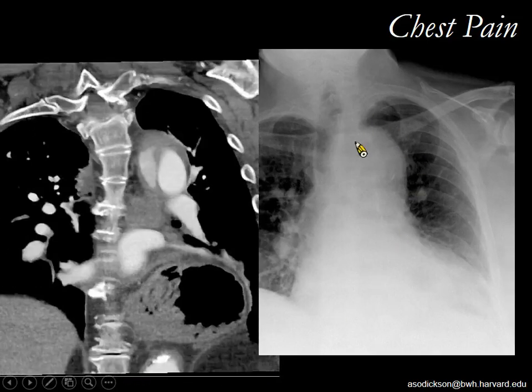So my main point here is to look very critically at the mediastinum on X-ray, use comparison imaging whenever possible, because without it, it's quite honestly very difficult to distinguish a truly widened mediastinum from an artifactually or apparently widened mediastinum due to low lung volumes or portable technique.